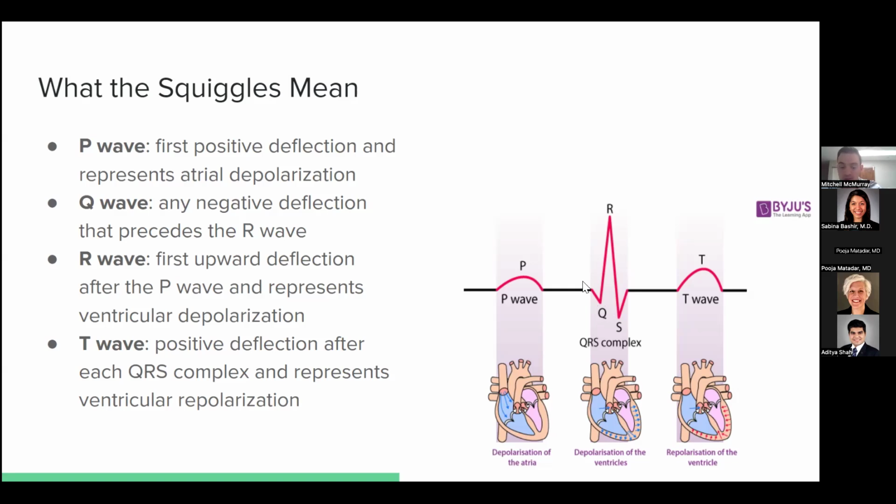So you'll frequently see leads that have very small Q waves.